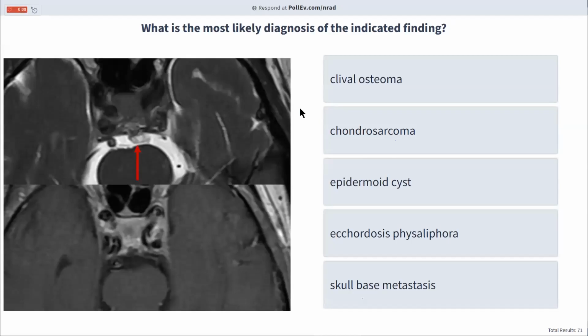Okay, just pause for a second. On the last question, somebody asked why not superior, inferior. I guess that would be perpendicular to the image, and I guess you could make the argument that is also frequency encoded. The slice selection is frequency encoded, but I guess I was asking on this image, which direction is frequency encoding? And so the answer is on this axial image you have left, right, would be the frequency encoded direction.